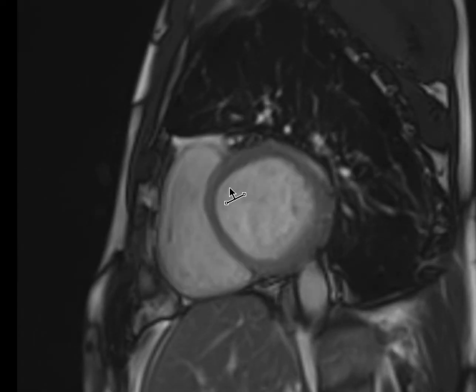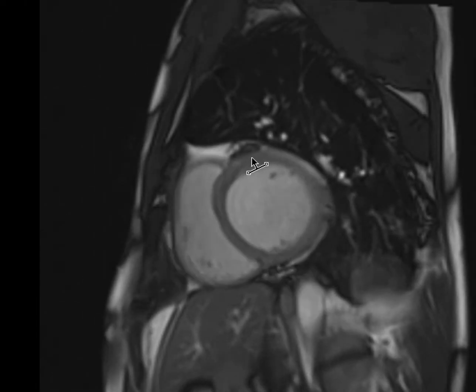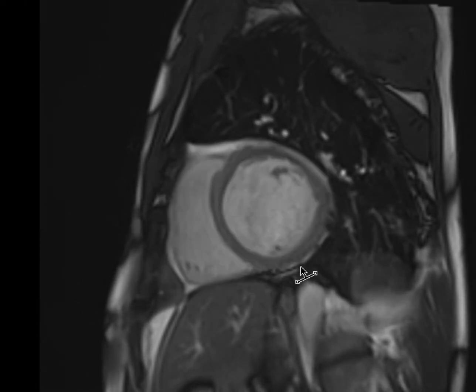For example, we cannot measure it in this slice, but usually we could measure it in this slice, for example, again. So we could measure the diameter of the left ventricle from the superior insertion point or the inferior insertion point to the opposite wall, which would correlate with the echo measurements and the index volume on MRI. And also, as you may see here, in hypertensive cardiomyopathies, yes, the left ventricle might be dilated with reduced function, but usually the wall is symmetrically hypertrophied, or the wall thickness at least would be preserved.